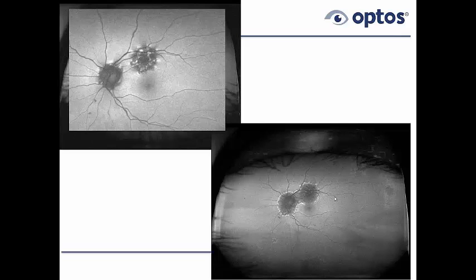Of course, you may have noticed that in a lot of these images we're not seeing a lot of lashes, so we take care to try to get the lids out of the way to get images where we're really getting 200 degrees across. If a patient has symptoms of flashes and floaters, I think those patients should all be dilated. But a typical routine patient, without flashes and floaters, without anything new, I think autofluorescence is certainly useful.